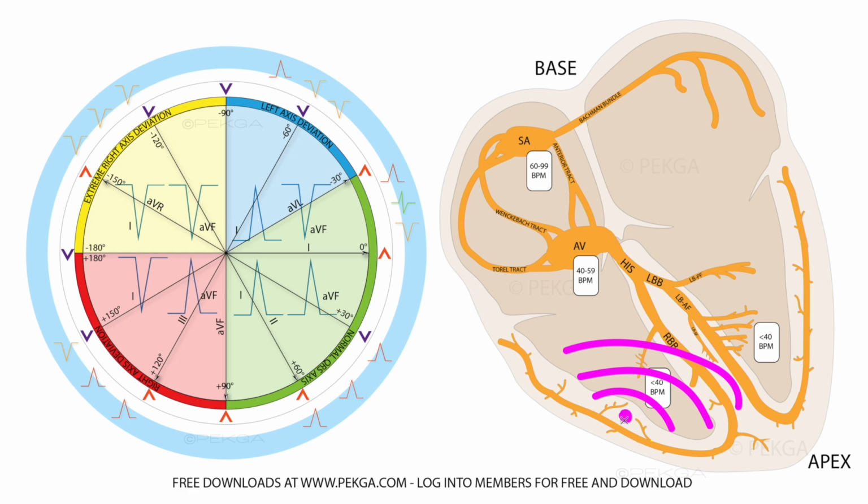So there's 140 signals being emitted per minute. In the atrium, it appears to be working the sinoatrial node. Whether it's exactly the sinoatrial node or an ectopic location, I don't know that yet. That is happening at a slower rate. And this is what's known as AV dissociation. So one is not related to the other. One is not affected by the other.